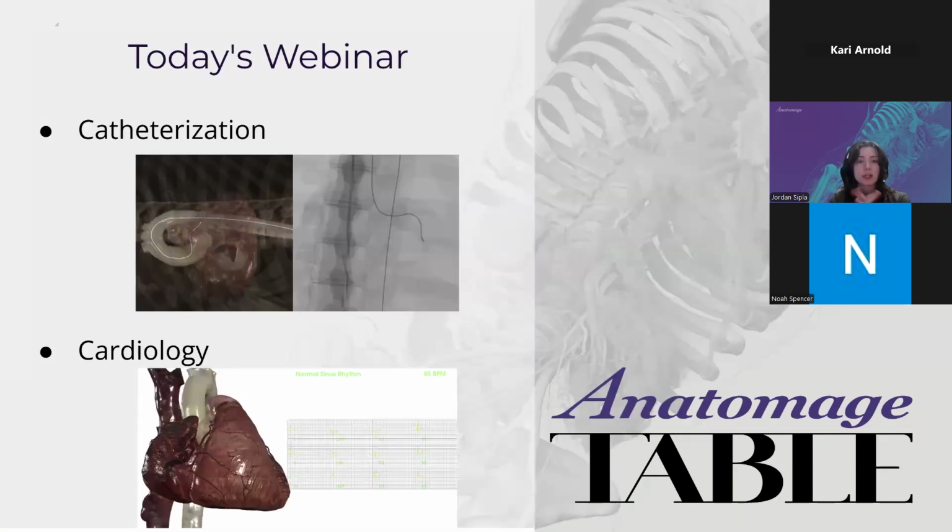Okay, so today we're going to talk about catheterization and cardiology. These two existing simulations are on the same theme, cardiovascular health and healthcare simulations. And we do have some little activities to go along with each one. So we'll get those up on Anatomage Share. We'll get those emailed to you so you have a guide as you explore these. First thing I'm going to look at is catheterization.